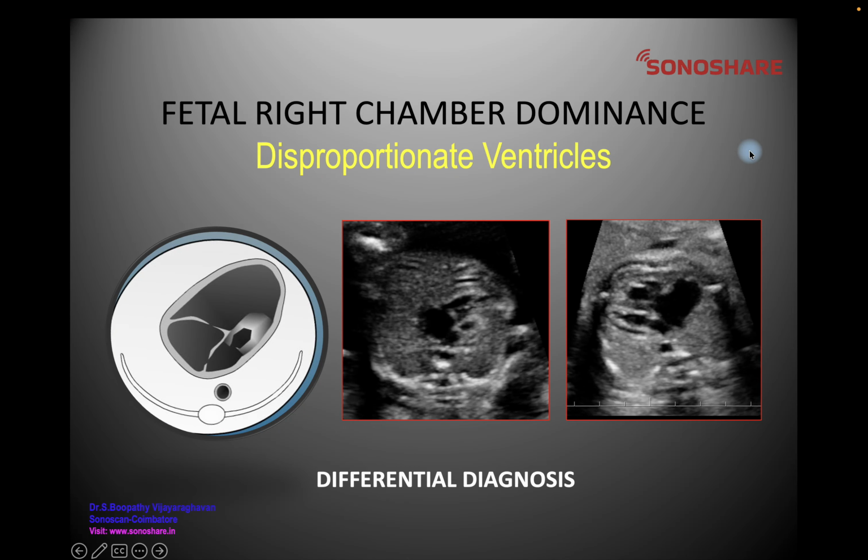Hi everyone. This lecture is on a lead point sign on fetal echo, namely the fetal right chamber dominance, otherwise called the disproportionate ventricles, and sonographic differential diagnosis of this condition on prenatal sonography.